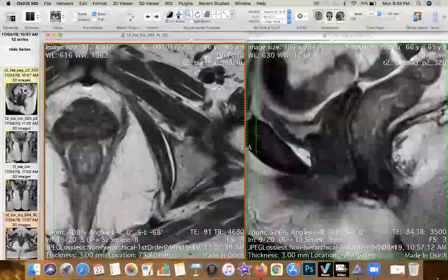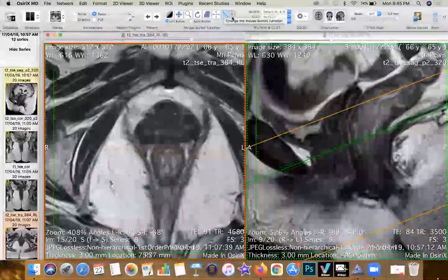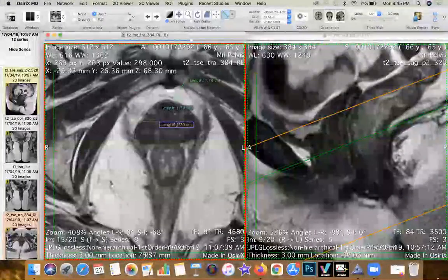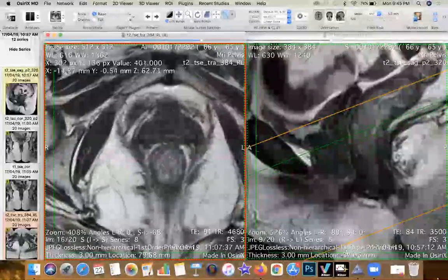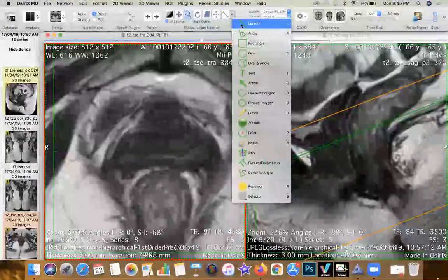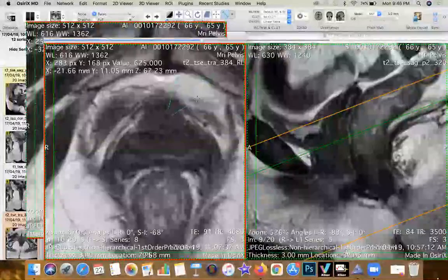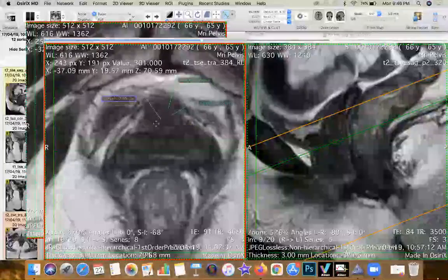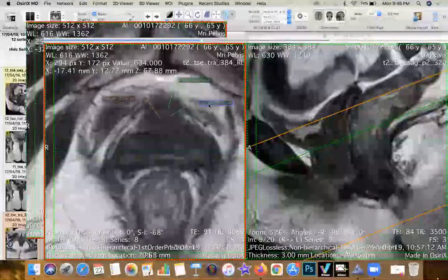So looking at the female counterpart of the same is pretty easy. You know that the urethra is very short. So that is the classic urethra you would explain. I showed you all the 4 layers of the urethra on the actual images. You can appreciate that even better out here. I'll just revisit that in terms of the female anatomy. That's the external sphincter. That's the so-called smooth muscle complex with the submucosa. You have the mucosal stripe, which is in orange. And the last one is the bright stripe of the urethral lumen itself.